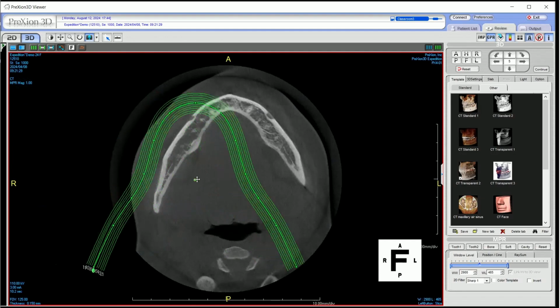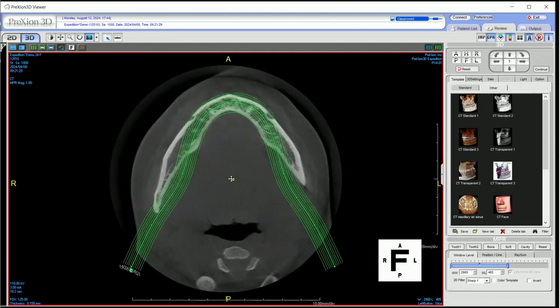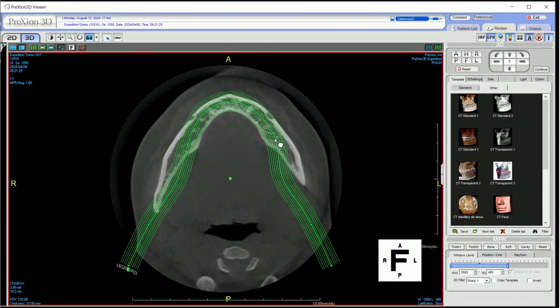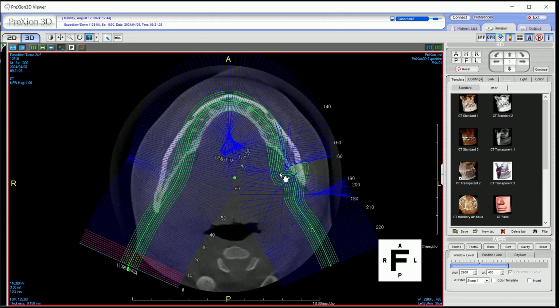Again, we're using that anchor point that is located in the inner center of that CPR curve. We're going to do our best to align the CPR curve with the lower arch, which means that you might have to individually pick up these tiny little anchor points along the CPR curve and reposition them.